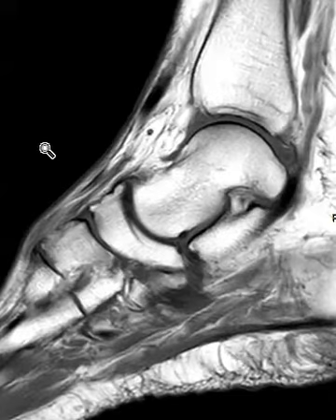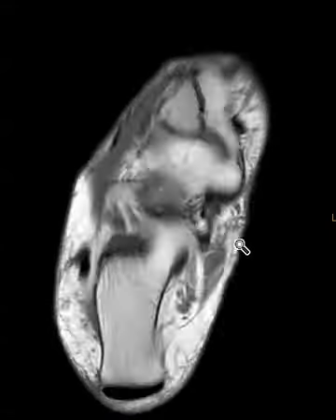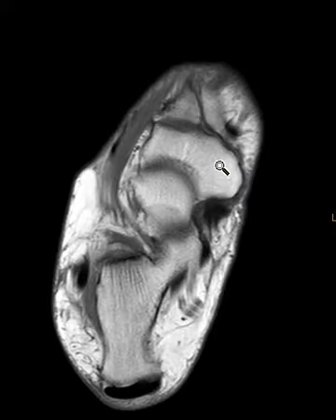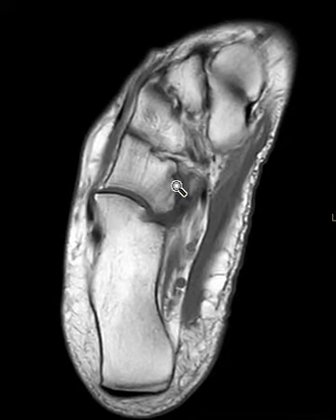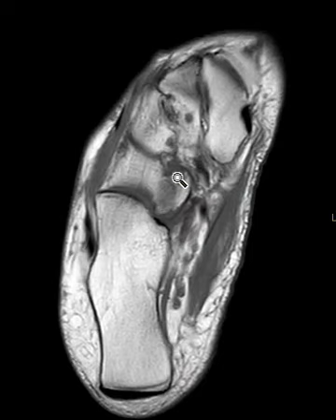We'll look at this one more time on an axial view to see what it looks like here. Now in the axial view, it's very hard to see because we're slicing through it longitudinally. Here is the navicular bone here, and if we go along the plantar surface, this is abnormal. This part is really broad, and then this is the cuboid bone, so it's right here between the cuboid and navicular bone, but very hard to see on this view.